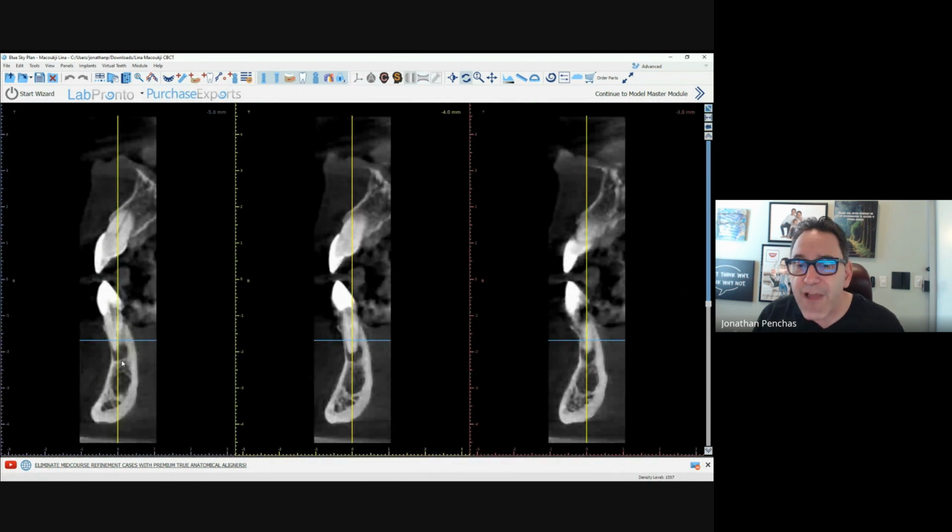Now, these are findings we found on the x-ray. Dr. Saab will tell you that the question was a loose crown. These are findings that are just findings with no pathology, no complaint, asymptomatic by the patient. That doesn't mean that we would take this CT for every patient just to find stuff, but it is so many times that you look at one tooth and you find other pathologies that the patient was asymptomatic, you couldn't find them in the mouth, and you find them thanks to the CT.